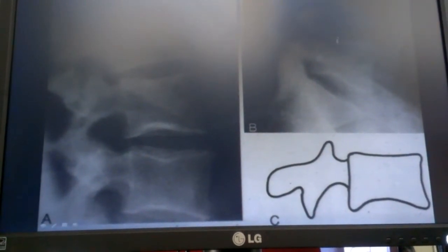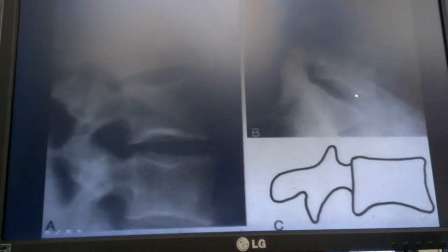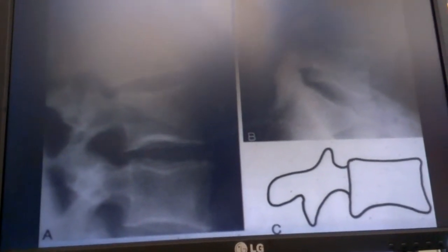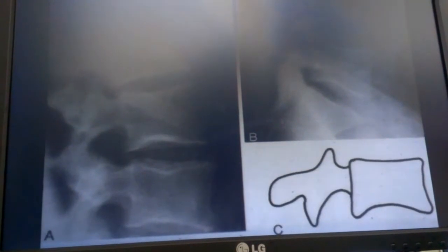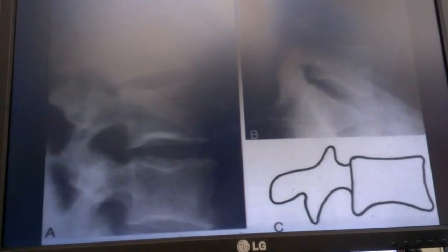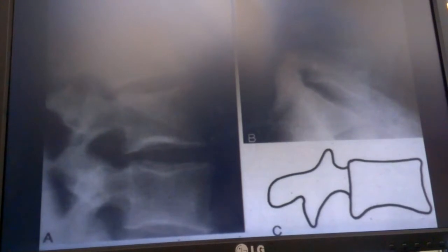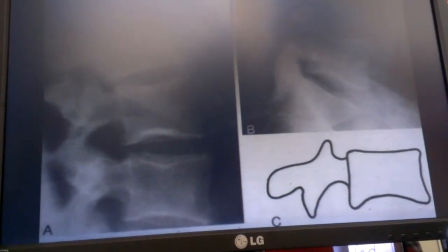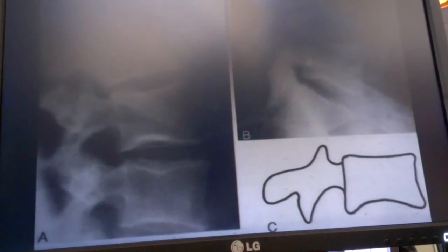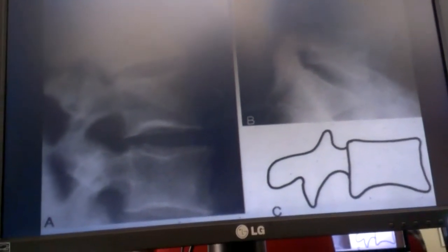Okay, what it does mean though, and I may have mentioned this, is that if it's not the posterior 2/3 of the end plate that's involved and it's more the middle to anterior, that might tell you that the person may have altered weight bearing, or lordosis has changed, or kyphosis, for an extended period of time. And so, you know, these impressions are all in response to gravity, right? So if they're in a location other than where they should be, the posterior 2/3, it might reflect long-standing loss of normal lordosis or kyphosis.